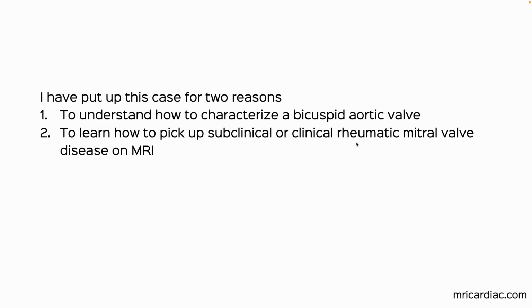And I sometimes feel bad. I did my sabbatical in cardiac MR in 2002, and then we put up the MR in 2003. And then it's 21 years later that I'm getting a sense of what rheumatic mitral disease looks like on MR. Nobody taught us. There have been no papers, nothing. I don't know if I'm going to be able to write this up, but otherwise, this is basically how you would pick it up, and it's all up there for everyone to look at.